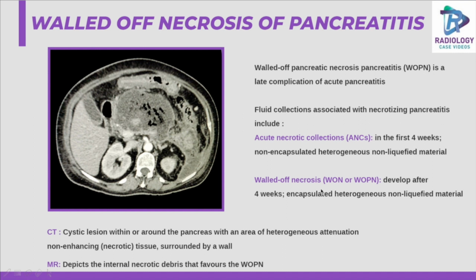After 4 weeks, encapsulated heterogeneous non-liquefied material develops, and this is called walled-off necrosis. And on CT, the lesion is generally within or around the region of the pancreas with heterogeneous attenuation surrounded by a wall. And presence of air foci within the lesion indicates infection.